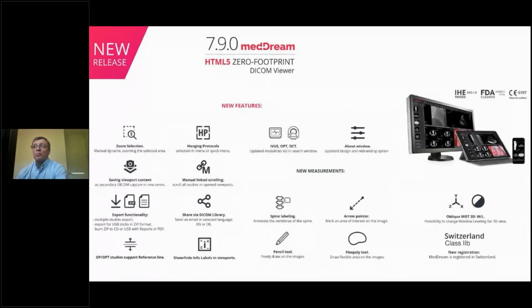Yes, another big part was OPT support. It took us 1 year to create that support. As you know, the biggest problem with MedDream was that OPT studies were shown as a multi-frame, and now they are split as images, and you can scroll, navigate, and get references.